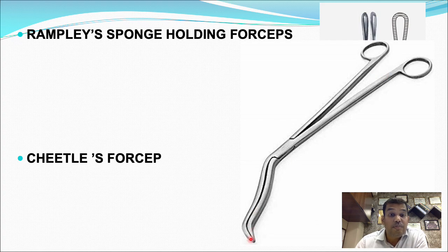This is basically used to transfer sterilized instruments from one place to another. As in, you are doing some surgery and you need some instrument from the sister, so the sister will use this instrument to remove the instrument from the box and transfer it to your hands. This instrument is kept dipped in Savlon solution. That Savlon solution will achieve a high level disinfection.